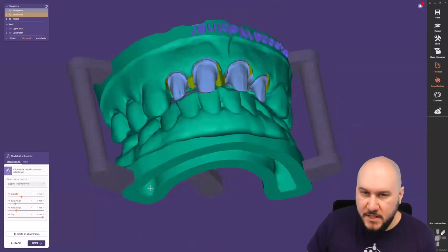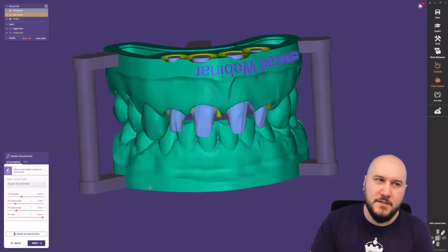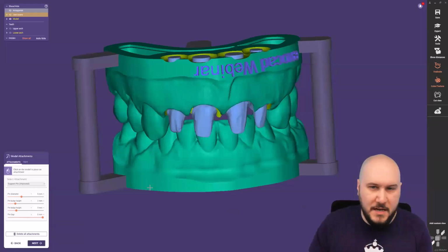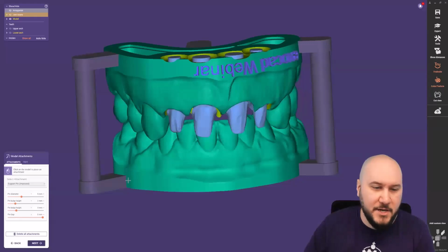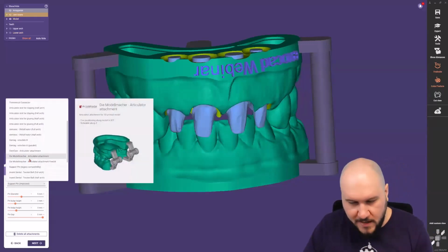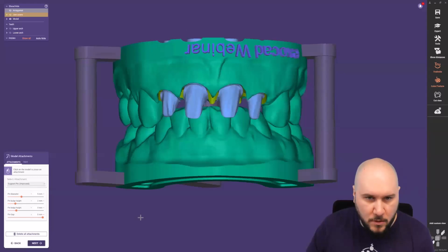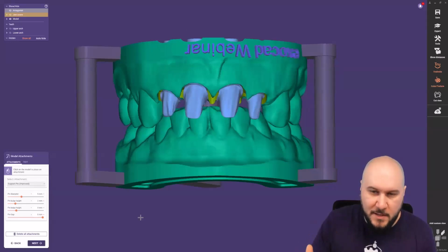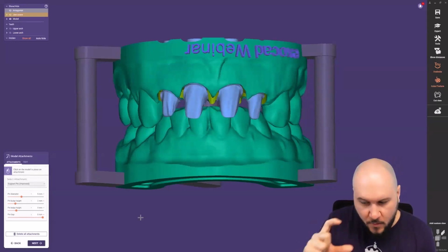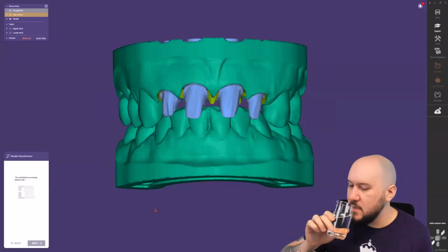So these are just things for the model creator. I think it's a big improvement for us and also for customers or end users, because we had the feedback that there are so many parameters with pin height and pin collapse and this and this and this, and nobody really knows what this parameter does. And now we have the GIFs, like the last version, and also pictures here for the attachments and the model type bases and so on. And I think this makes life really, really easy for everyone. So also for me, because sometimes I just look for that and I think, what does it mean? Because we are haptic people, and when we have a picture, it's really, really better for that. Okay, so everything's good, Thorsten?